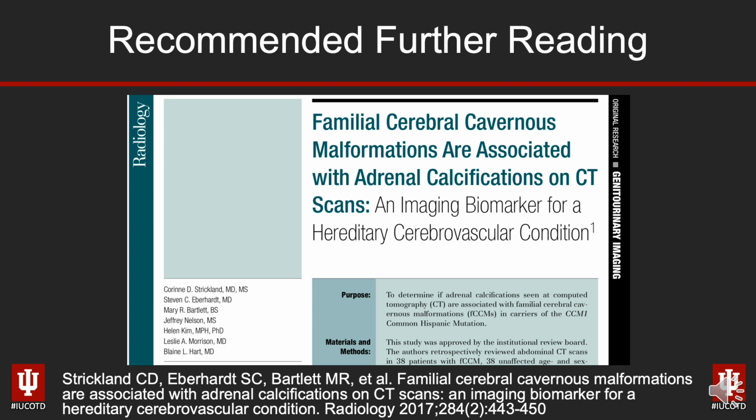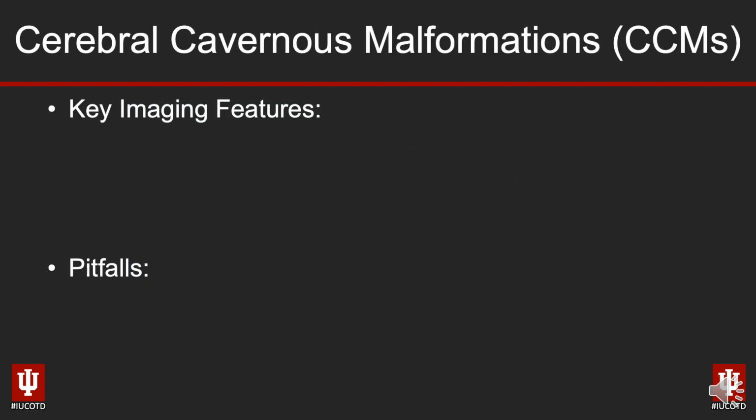So whenever you see this, don't be afraid, as Mark says. Take a look at the patient's belly CT if they happen to have one. Look at the adrenal glands. That may be a tip-off that you're dealing with something syndromic. Okay, so let's wrap this up. It's getting a bit long.